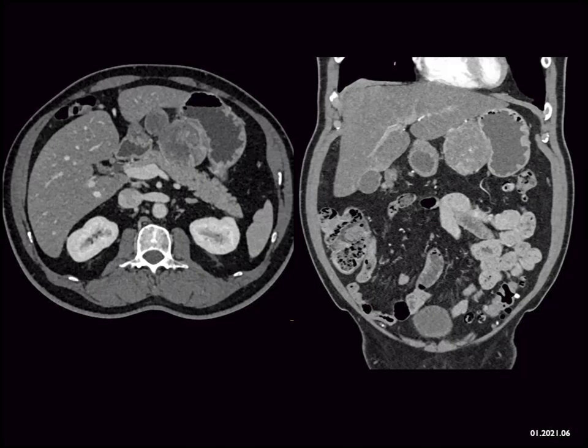Sometimes there's better locations. Is this adenopathy you might think about? But when you look at the choices, it's not a pancreatic cancer, and it's not an abscess, and it's not lymphoma. It's classic for a GIST tumor. I've shown some of these in the past. There are a number of them on CTisus.